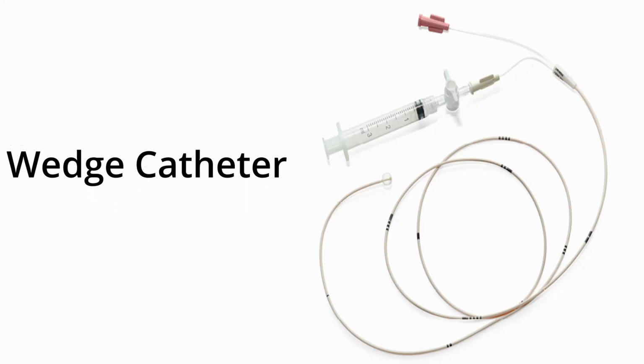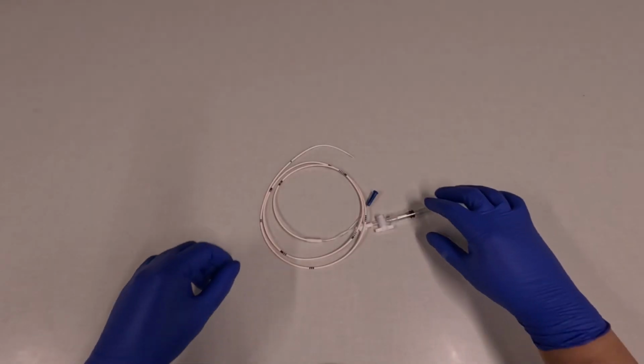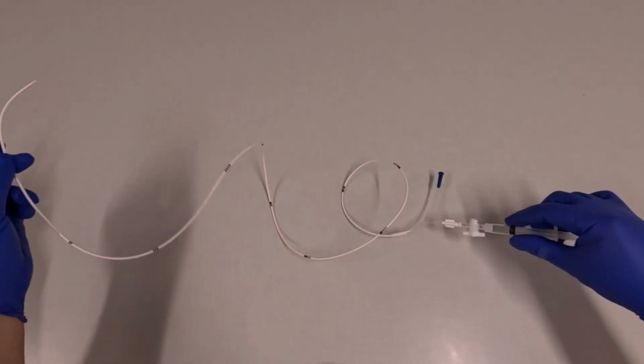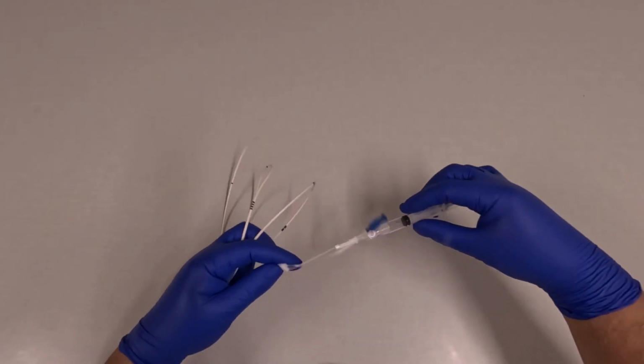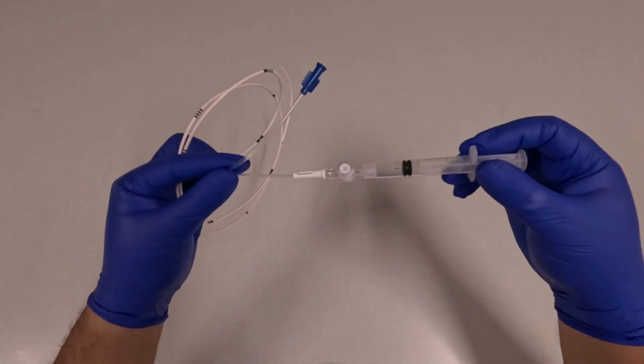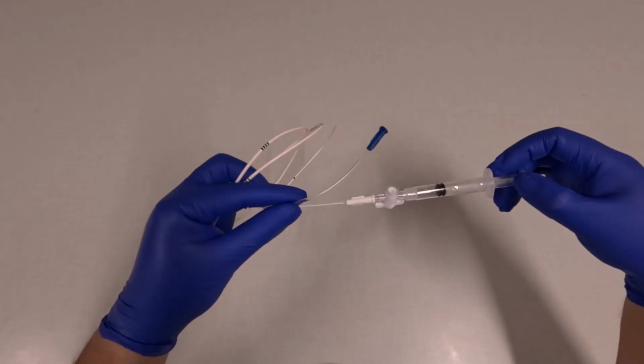In this video, we're going to be discussing the wedge catheter. This is a simpler version of a Swan-Ganz catheter, and so we're going to start with this. There will be a full video on a Swan-Ganz catheter at some point in the future. When you open the package, you get the catheter and a small syringe.